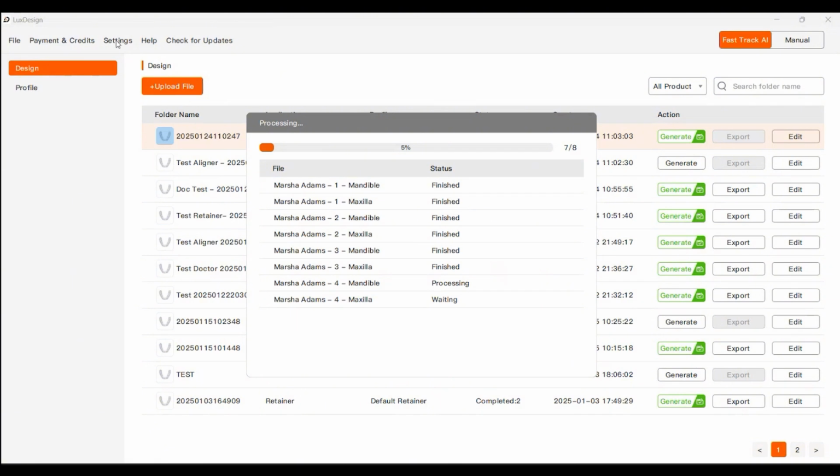You're also able to change some settings in your app. You can also make sure that you are authorized if we have new material, like offerings or anything like that, especially for LuxFlow, which we'll go into more later. It's important that you're staying authorized. So yeah, that is a little bit more about the interface.